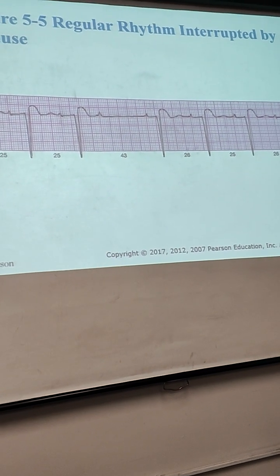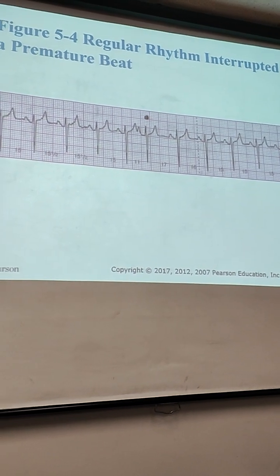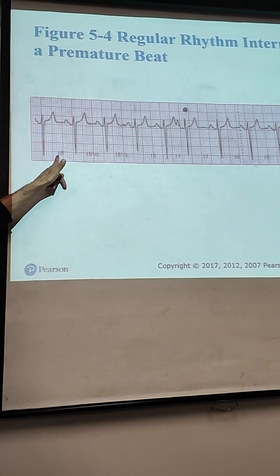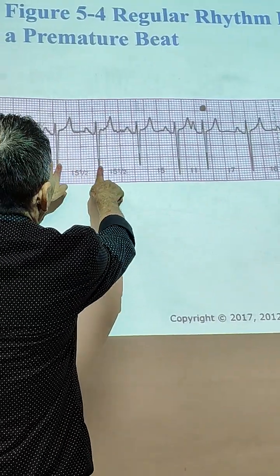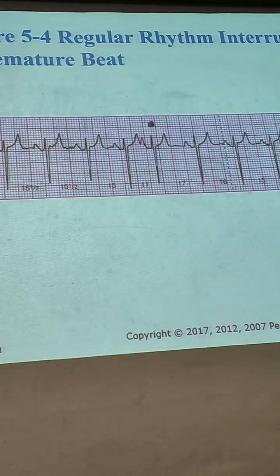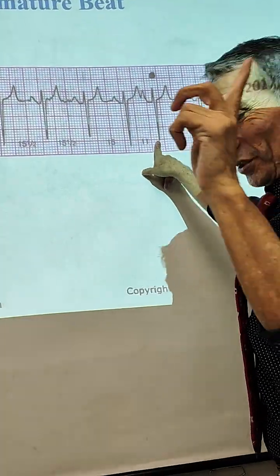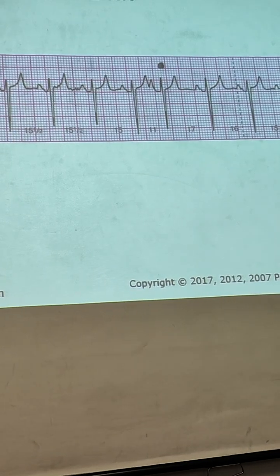Well, then we're going to talk about why, but for now we're just looking at the picture. Regular or irregular? Regular. Look at the numbers. But let's say that you don't see the numbers, just think about, from here to here, from here to here. It's regular because it's all in the same range. Exactly. But then there is something right here. It's smaller. Yeah, but there's only one. So that's why it's regular. But we're going to call it differently. It has some exceptions.